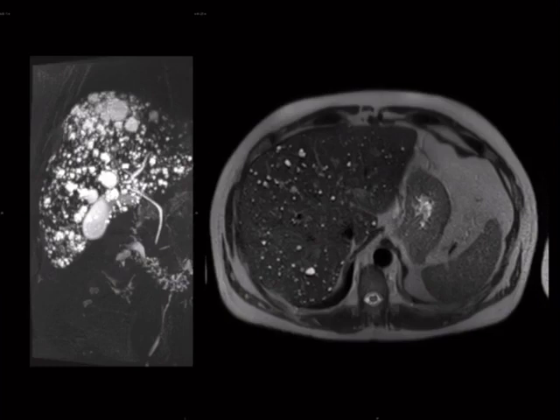They gave us an MRCP, and so anytime you see an MRCP, obviously they want you to look at the biliary system. If they just wanted you to look at the cysts, they would not have shown you the MRCP. You can see the cyst just fine on the regular axial T2. The MRCP is for looking at the ducts.